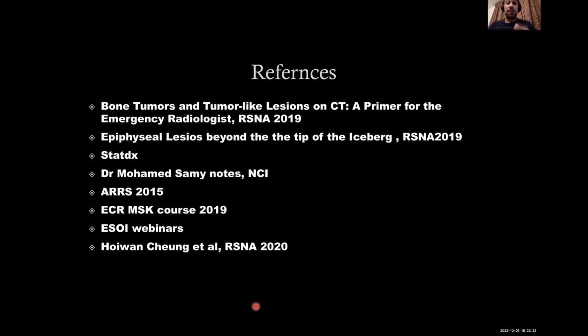All the best. And for the enostosis, the bright borders, the density is more than 1060 Hounsfield unit, which is higher. It should be higher than 1060. Lower than that, there is a concern about sclerotic mets.